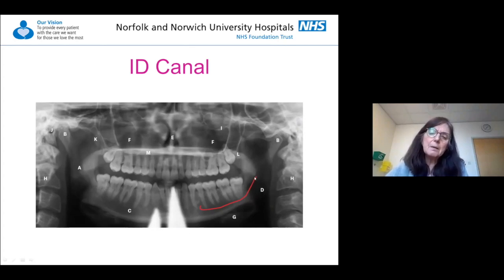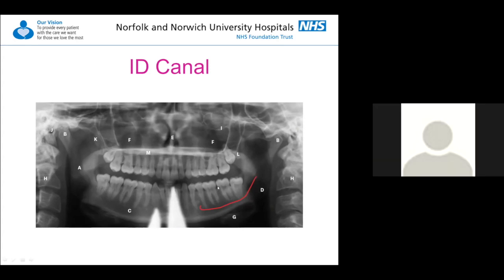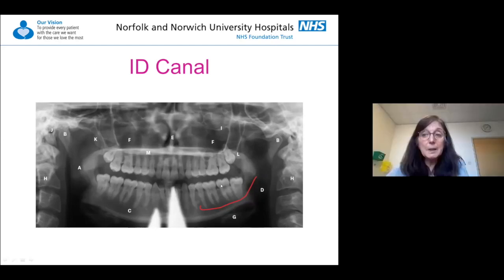You can see here that the inferior dental canal is quite close to the roots of molar teeth, so numbness at the time of dental sepsis is not that uncommon, and particularly if you get an osteomyelitic process going on or osteoradionecrosis, it's really not uncommon to get lip numbness. Clearly, if you have a fracture in this area from the angle to the premolar, you can also get numbness as a result of traction on the nerve.